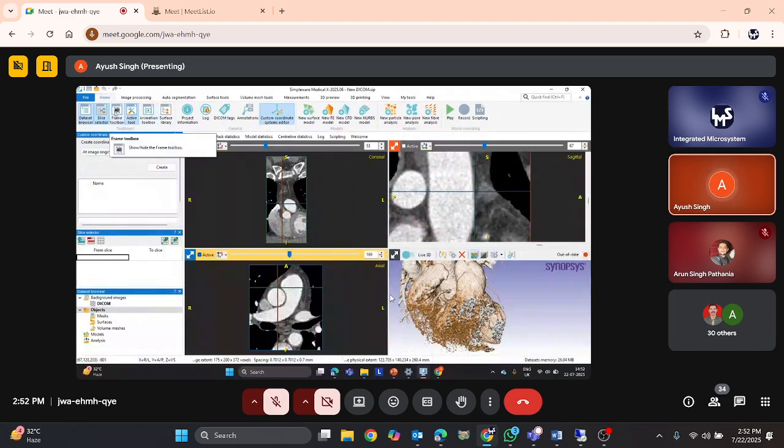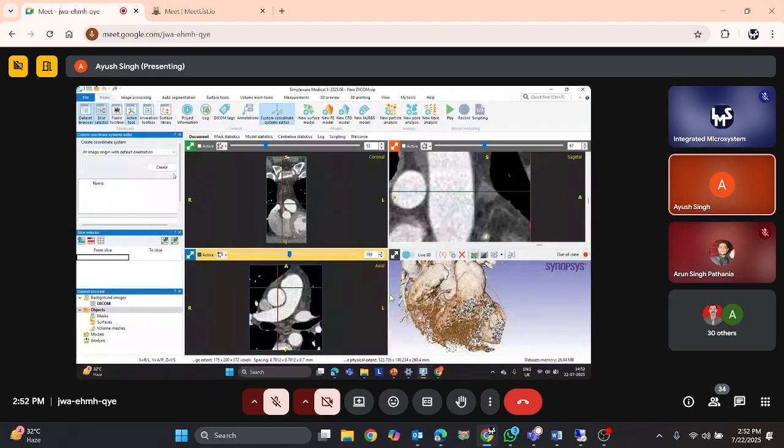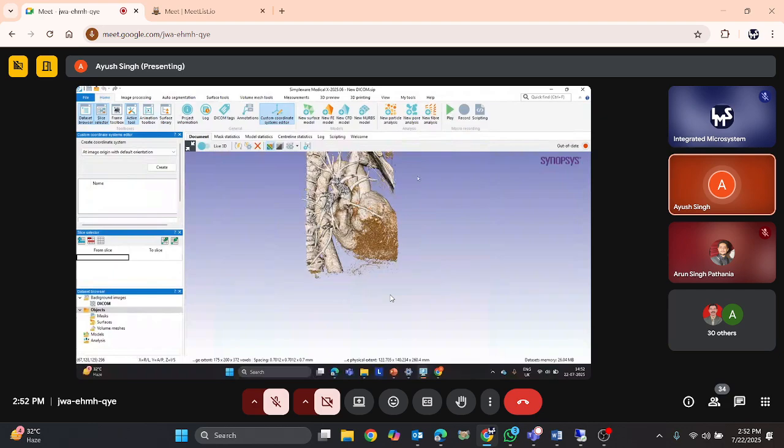One might be wondering how this particular 4D data set looks like. I do have the file. Either I'll show you at the end of this session or in the cardiovascular session that we'll be covering on day 4. In that also, my colleague Pratik will be showing how to navigate through the 4D data set. So this is one such important feature that we can work on. This is just to visualize the data set that you're working on to get familiarized with the CT MRI.